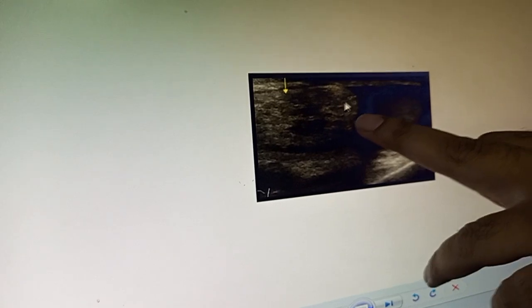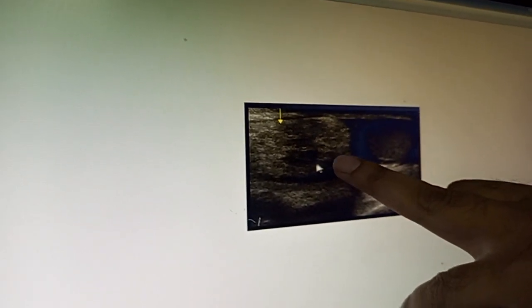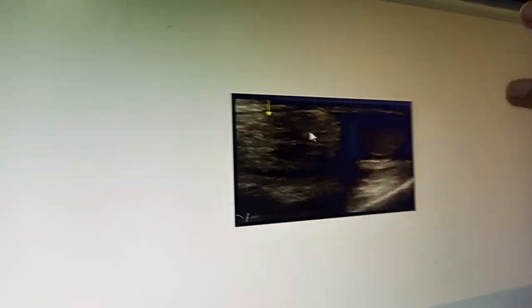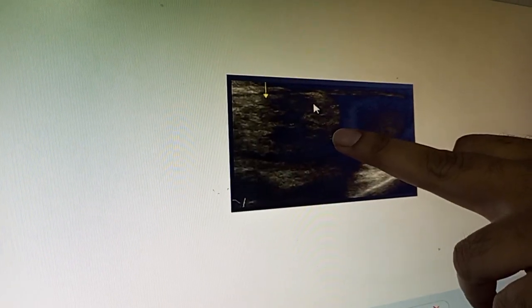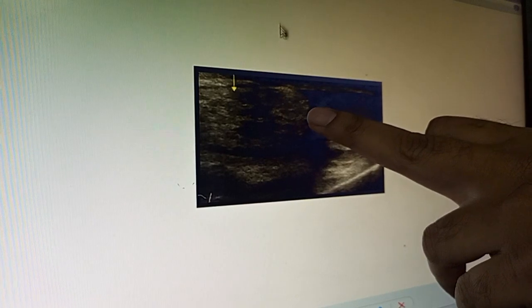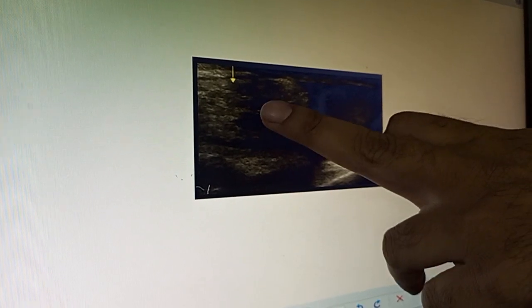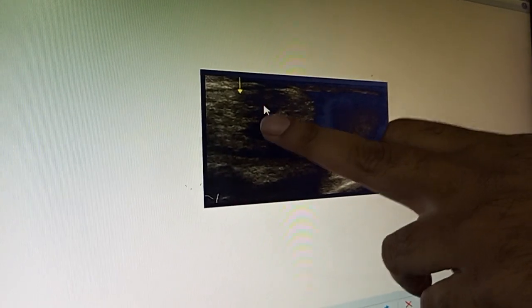This is the case of the scrotal hernia. You can see this is the omental fat, and there can be gut; omentum depends on the type. In inguinoscrotal hernia, there will be a gap in the inguinal region, and the omental fat or gut can also be appreciated on the scrotal side. So this is the case of the scrotal hernia.